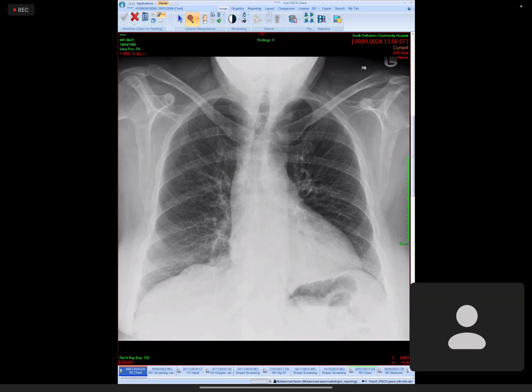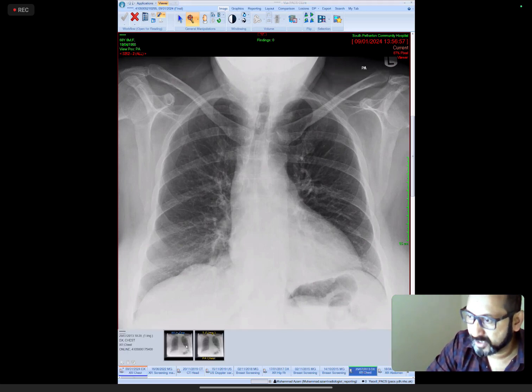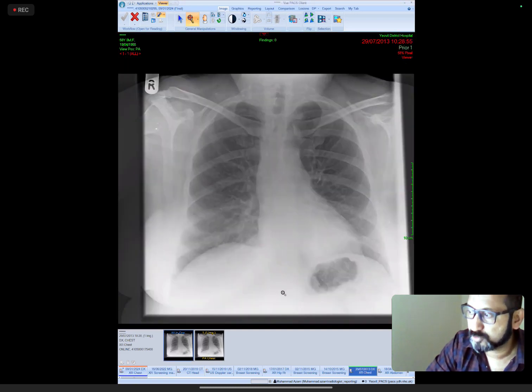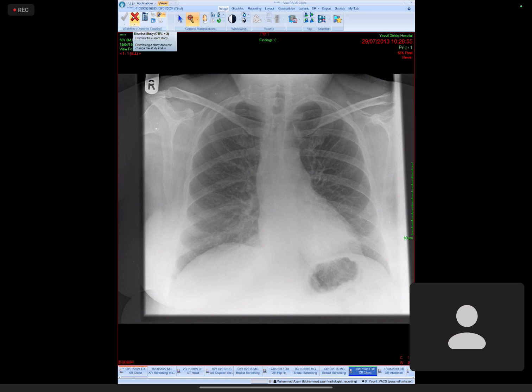Yes, please. Sir, this small right pericardiac opacity, could this be a consolidation? Good pick actually, but yes, I think my apologies for that. But I could show you another case of this patient in 2013. Okay, yes, I think you are absolutely right. I should not have given you that case, but that yes, is normal actually, unfortunately. So good pickup, by the way. I should thank you. I'll exclude it from my list probably.